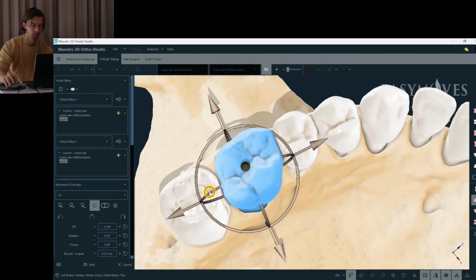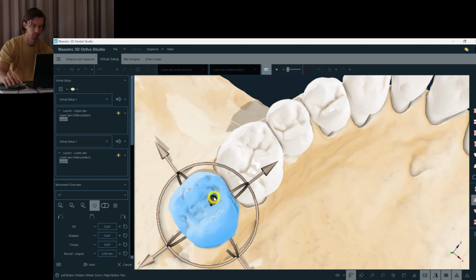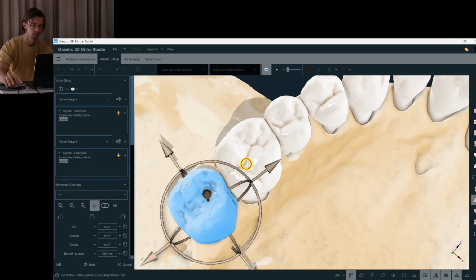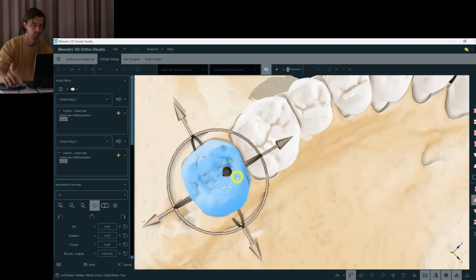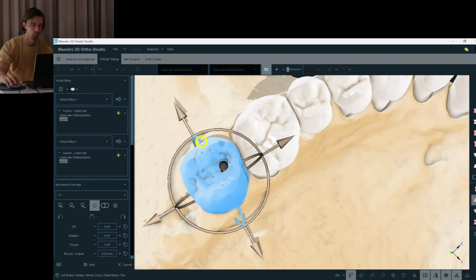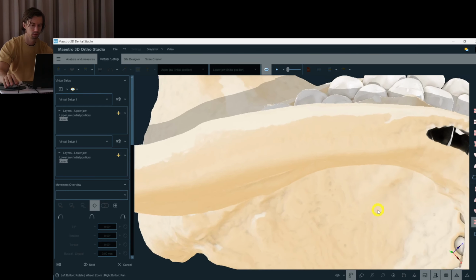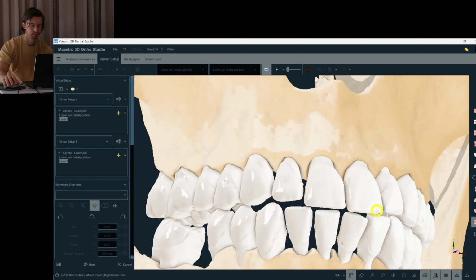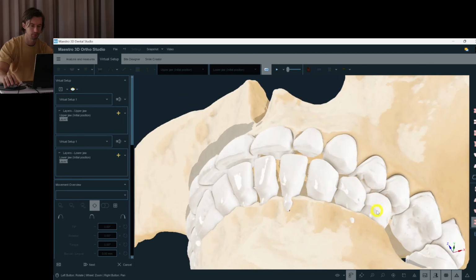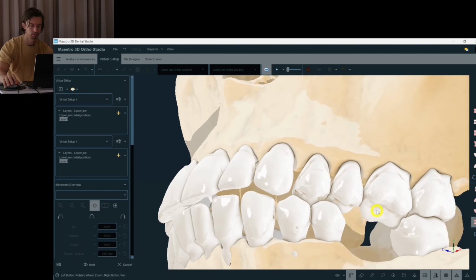Lining all the teeth. I don't touch the second molars because we cannot expand them with the aligners. We don't have enough anchorage, enough force to move them with just the tip of an aligner. That's why I don't even touch them. Okay, this is our first layer, upper and lower.